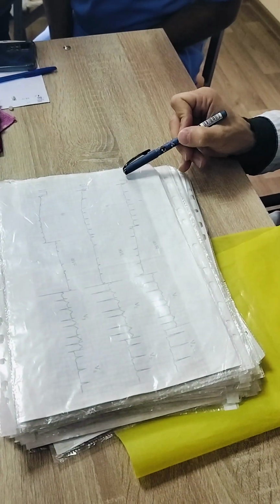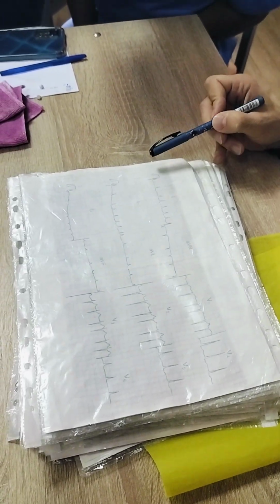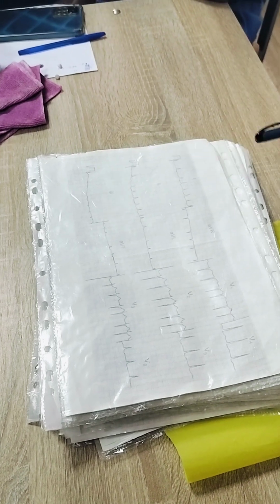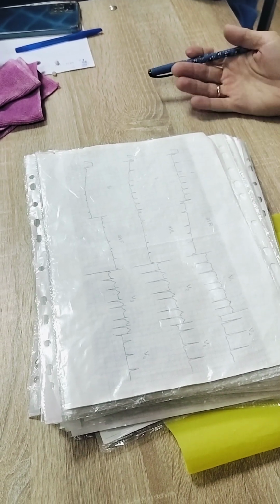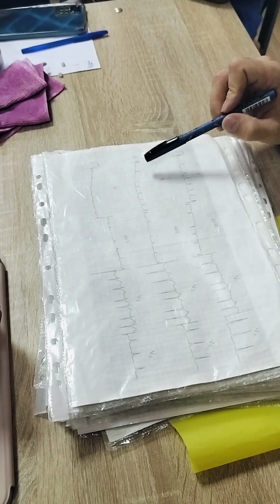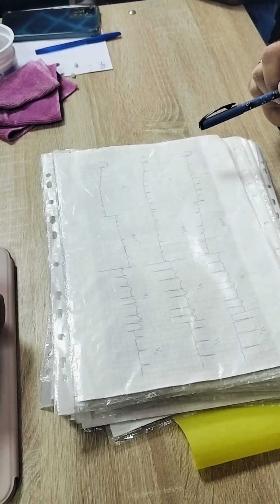The big cell is 5, 2, 3, and 2 more, so 10 millimeters. Quality of ECG is okay, so we can continue assessment of this card. Next, pacemaker. Look at second standard lead, this one, and search for P wave.